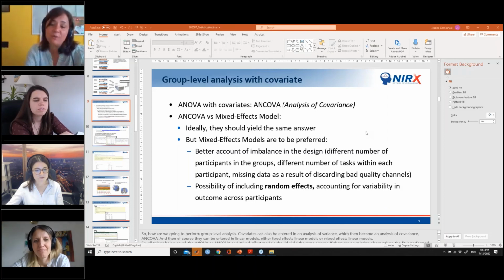That is how you say that you have 1 session per participant, and all participants underwent the same different sessions. So this is how you define a within subject design. Yes, but definitely keep the different runs separate.